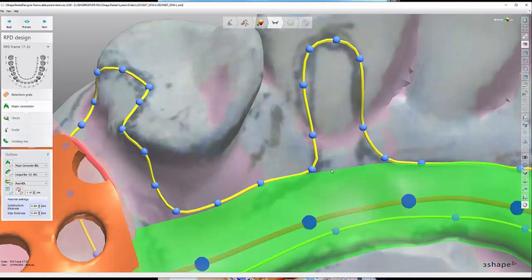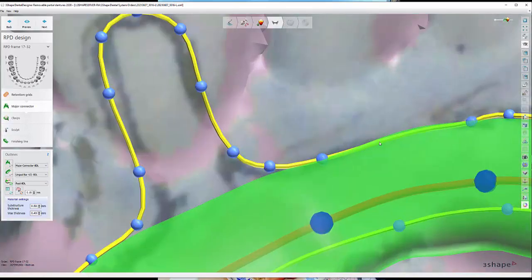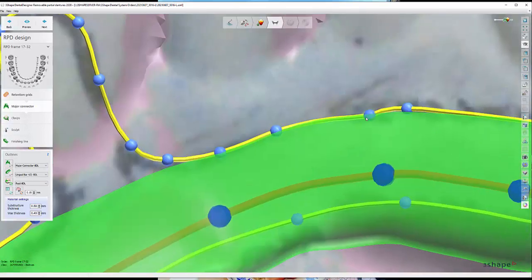And when you do finger rests, for us, like this finger rest here, you don't want to be like this. We want this to be, think of like a tree. We want the base of that tree to be strong. So that's why we kind of flare that out at the bottom a little bit. Usually our drawings are pretty accurate, so they'll give you a good indicator.